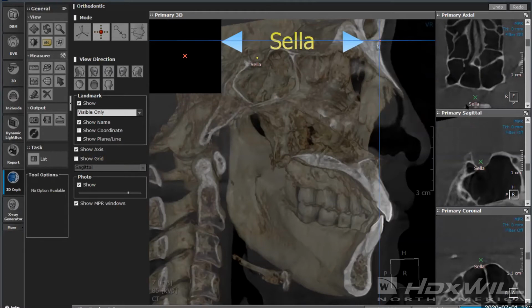So again, you can also go back, and we have, thankfully, the undo and redo options. So if you go through it and you put something in the wrong place or you clicked in the wrong area, you can certainly undo and redo within there as well.